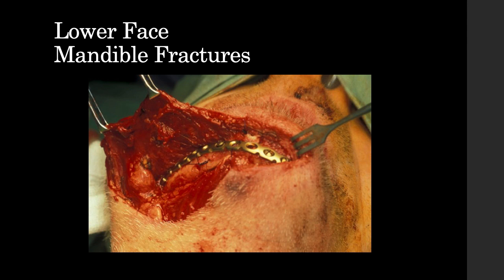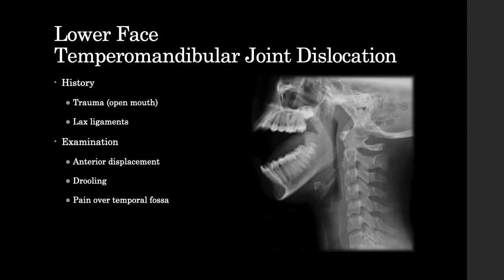The mandible also can dislocate. So this is where, again, a lateral face radiograph comes in useful. And you can see clearly here that the TMJ is completely dislocated and that the mandible is actually hanging quite low and quite anterior, and it's angulated quite forward as well.